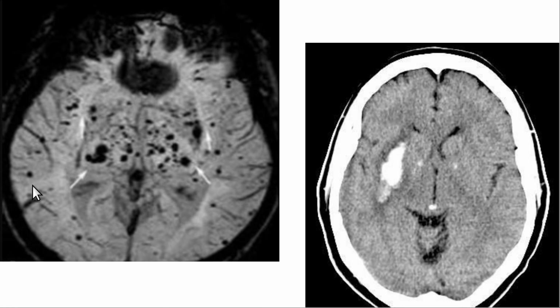But the reason why I think that's a bit of a joke is because I look at these all the time. I've seen thousands of cases like this. And I routinely see both present in the same patient, central bleeds and peripheral bleeds. So is it due to hypertension, or is it due to amyloid angiopathy and Alzheimer's, or are they maybe the same thing? And so what I'm basically saying here is I think they're largely the same thing.